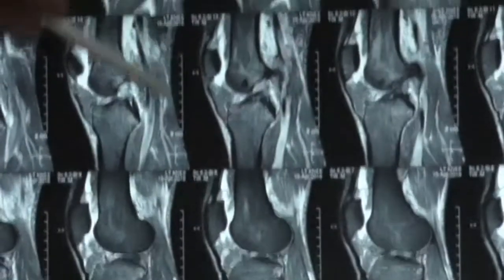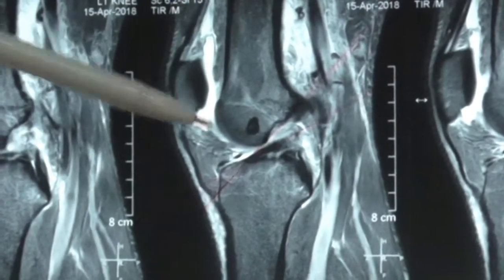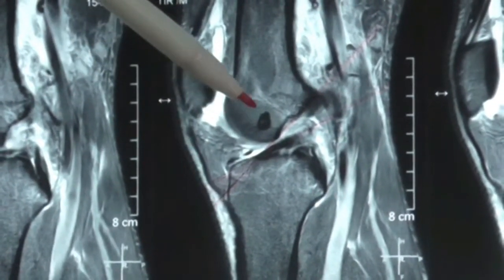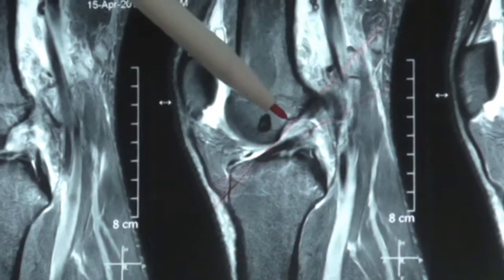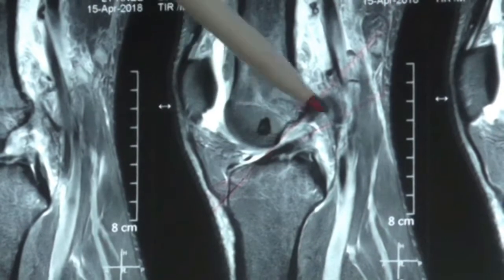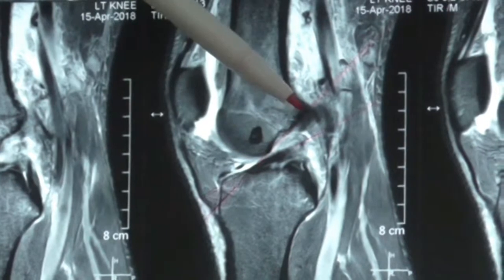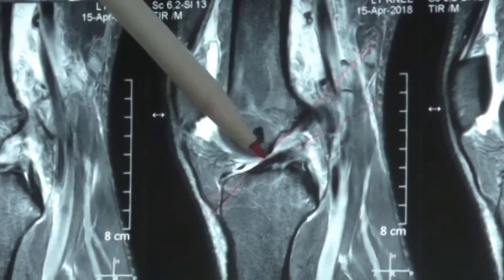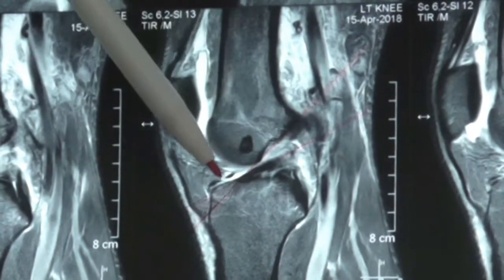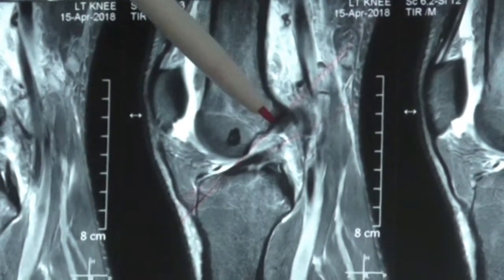So here, if you focus on this one, Vijendra, are you focusing on it? Yes, sir. This is very nicely drawn by my fellow Dr. Vijendra Adhikari. Now here, this line goes from the Blumensaat line, and this is the central axis of the ACL. So you can see that the ACL angle is not going towards the Blumensaat line. Though most of this ACL is visible out here, this ACL is going down. So the apex of the angle is not in the femur, it is in the tibia. Ideally, it has to be in the femur.